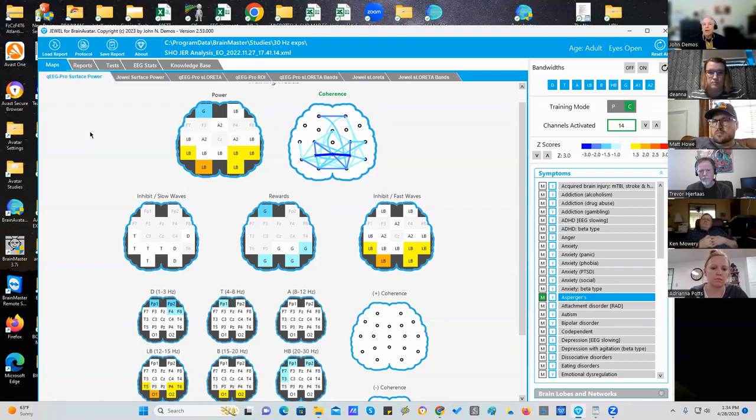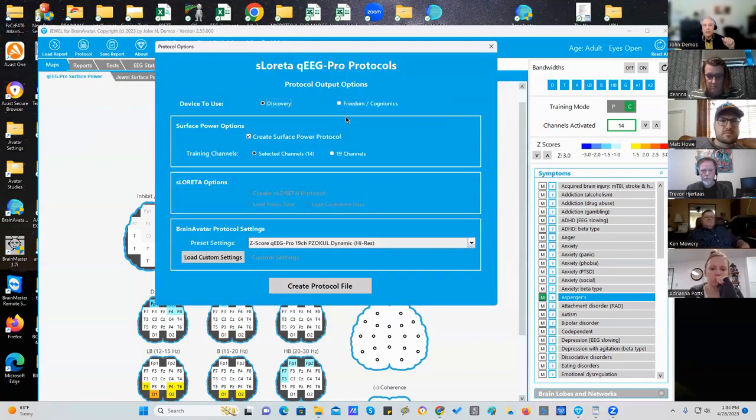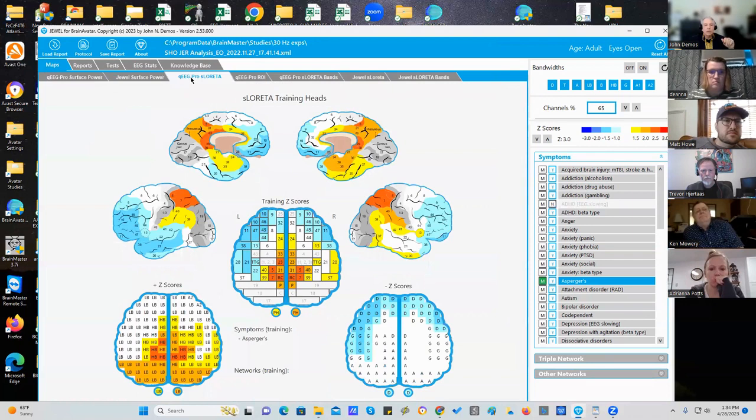Now, the software does not have the capacity to go through the thousands. Can you imagine how many thousands of connections there are? So what does the software do? Full QEEG Pro protocols. So what it does, in answer to your question, is, now I'm one step ahead of myself. Let's go to QEEG Pro.